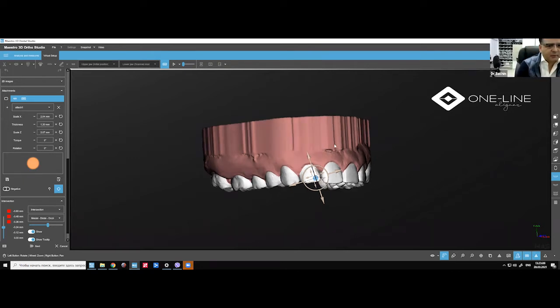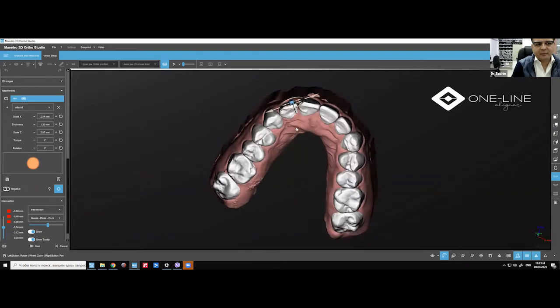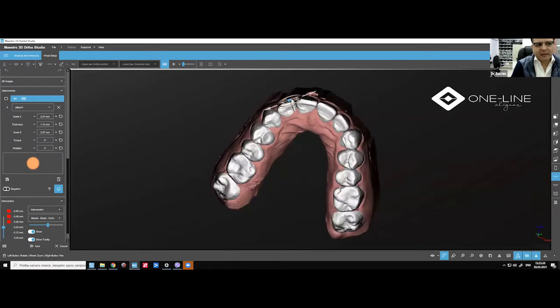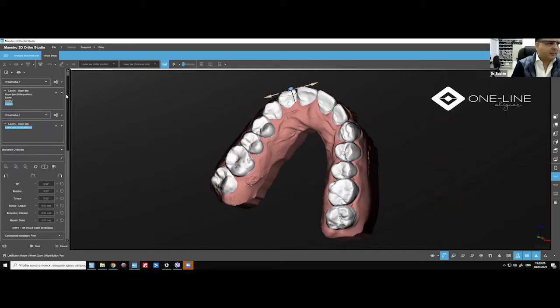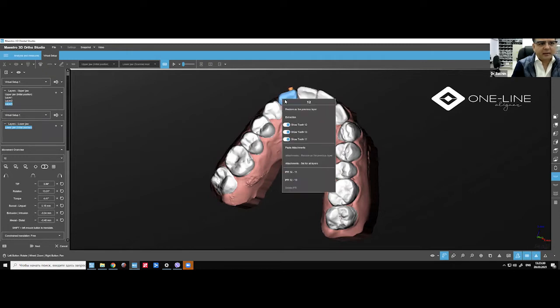Fine, right now I don't use this, so we're going to change back. For 13 degrees, this is good enough. So 1.1 is good in this case. We can also double it if we need to. We have done positive rotation on the lateral incisor, and we can also add here.